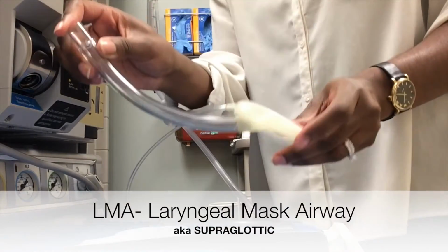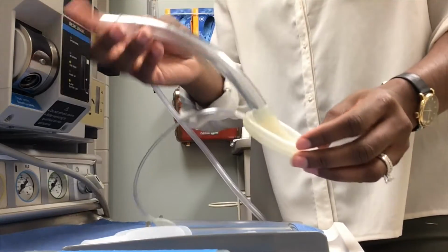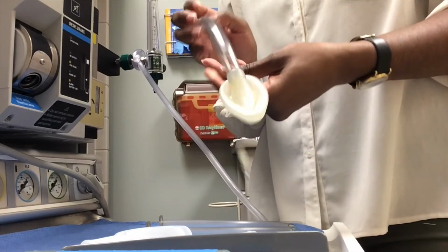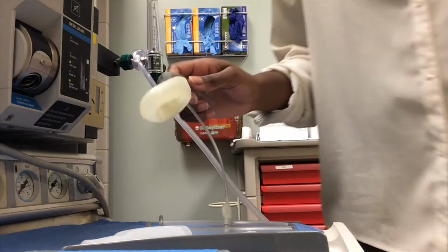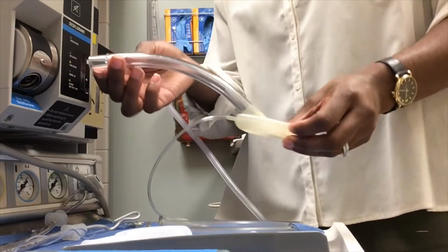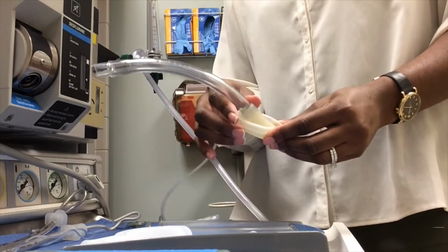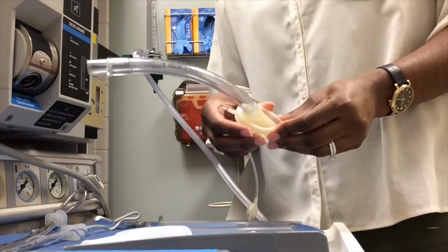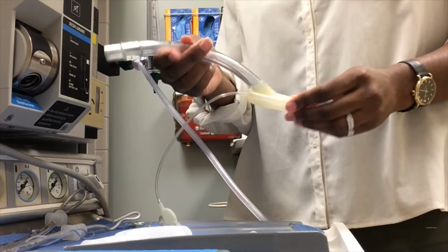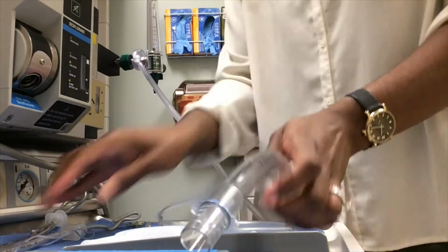So back to this LMA. This is also called a supraglottic, so it sits above the glottis. And this gets filled up, and it doesn't protect the airway as much as what we're going to talk about next, which is your ET tube. So like I said, it doesn't protect it as much, so you could have gastric content still coming up. And you do not want to use these if you have your patient prone, because it doesn't protect the airway, or with severe GERD, because then your reflux can come right past your tube.